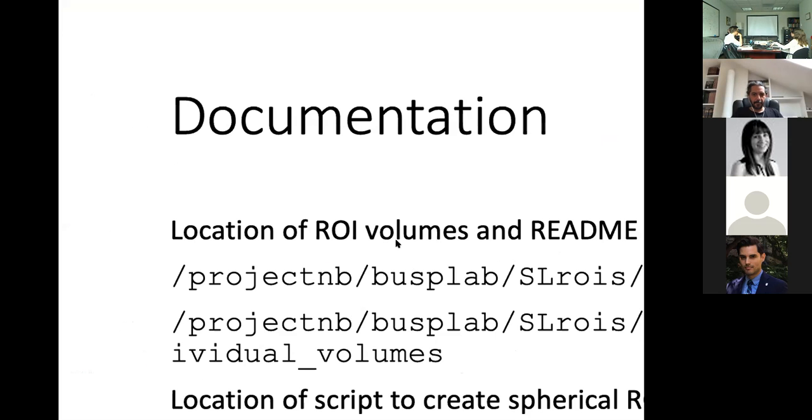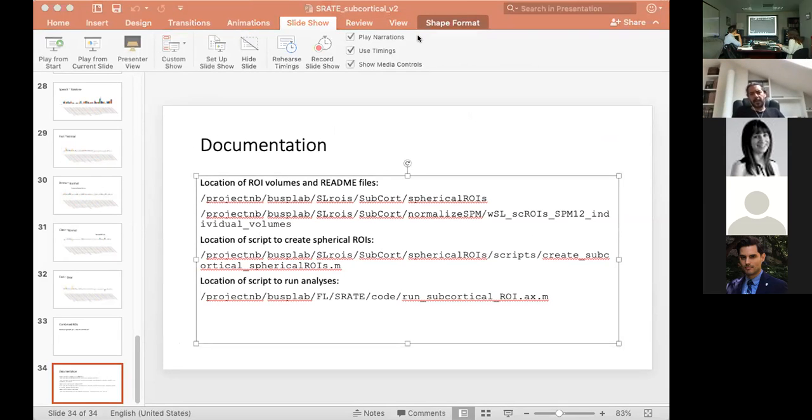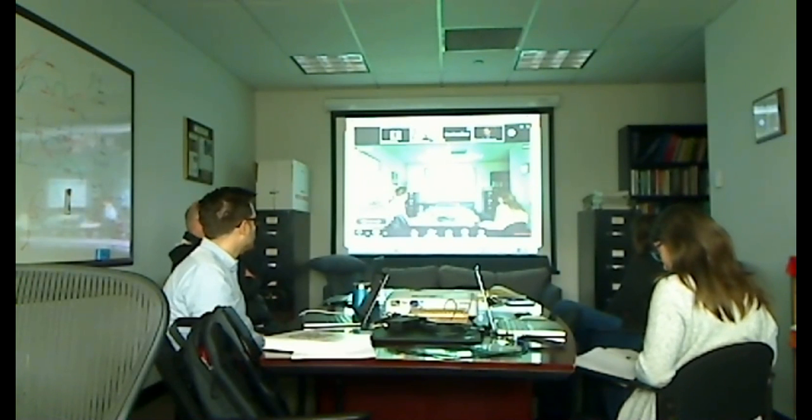In the meantime, there were a couple of things that popped up there that were significant. Even with these same results, I'm just trying the weighted probabilistic atlas to get a little more information, because the unweighted one, I'm not totally sure what it's doing, whether it's just taking any voxel that shows above zero values, which might be the default and would be an overestimate of the regions that we care about, a little wider than we really care about for looking at smaller effects. It's not non-zero, it's the most likely. So at every voxel, it's the region that's most likely.